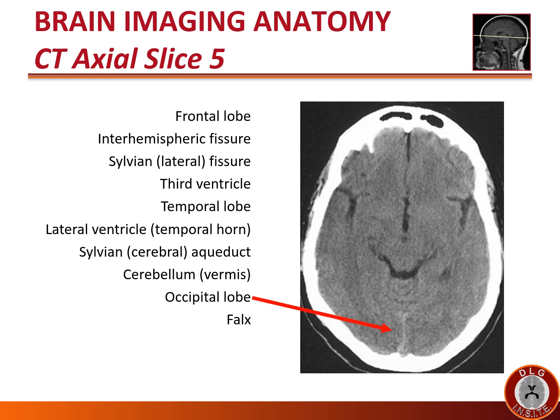At this level, we continue to see the occipital lobe behind the cerebellum. Once again, the wine goblet appearance tells us that the occipital lobe is there behind the cerebellum, with the glass of the wine goblet being the vermis and the stem of the glass being the hyperdense meninges or falx between the two cerebral hemispheres, between the two occipital lobes.